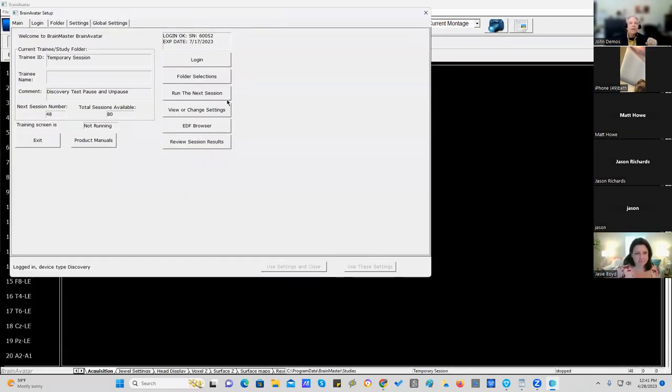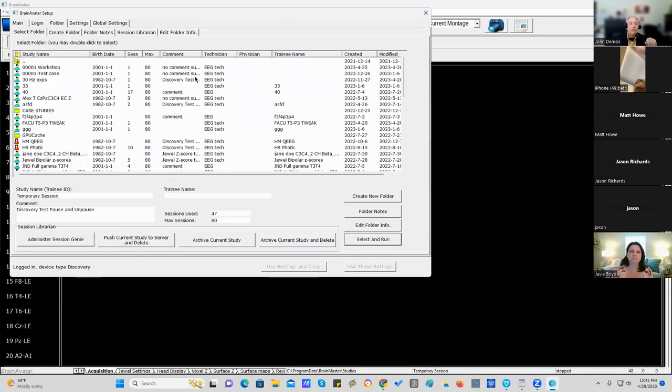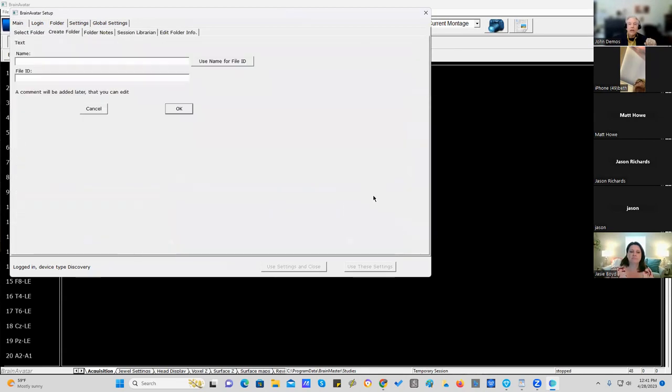When we begin, I'm going to start right from the beginning because some of you folks have never done any EEG work with BrainMaster. We're going to click Folder Selections, create a new folder, and we're going to call this Workshop Test 44.